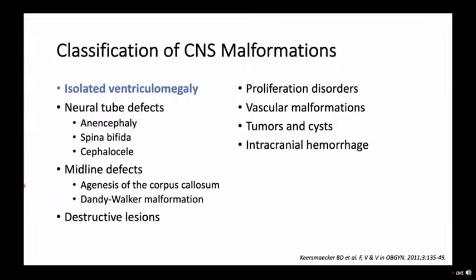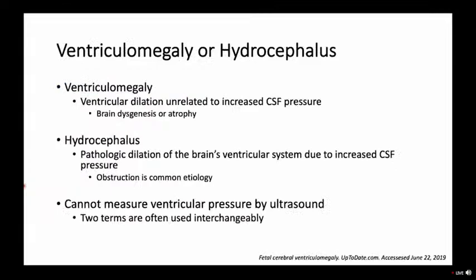Ventriculomegaly, definitely worth some time of our day. Again, I spent a bit of time on why that measurement is so important, to be in the proper position and have your calipers aligned properly. So ventriculomegaly is a dilation. It is not related to cerebrospinal fluid pressure. Hydrocephalus is pathologic dilation due to obstruction and increases in pressure. We don't know by just doing an ultrasound in the fetus that ventriculomegaly causes an increase in pressure.